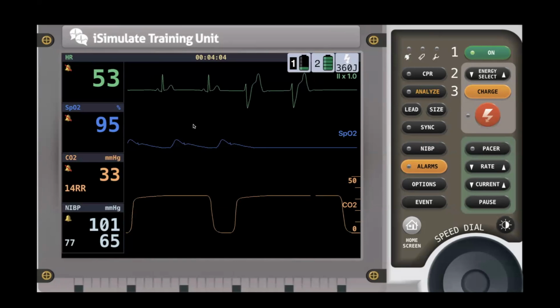Unlike this, where we see these beats, these are wide, right? What do we say about wide beats? Going against the gradient. So these would be called premature ventricular contractions, or you'll commonly hear people say PVCs. These are excited beats that are outside the normal conduction that are firing prematurely or ahead of the normal conduction cycle.